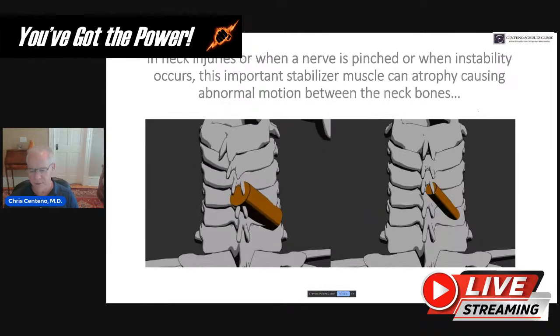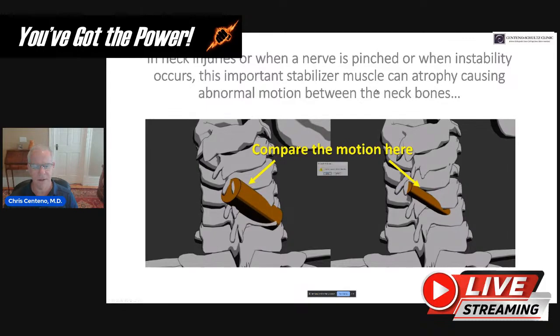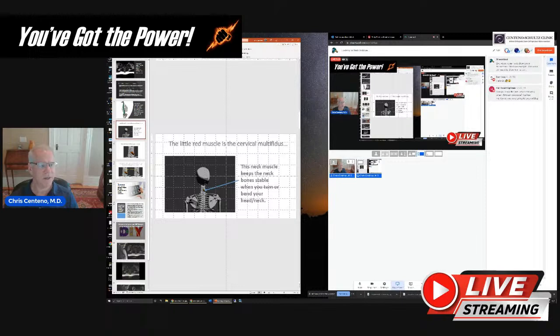Now we're going to go the other direction here. And I'm going to, hold on a second here, guys. I'm going to stop the auto run on that, so I can go through it a little bit slower, because that's just kind of racing through.